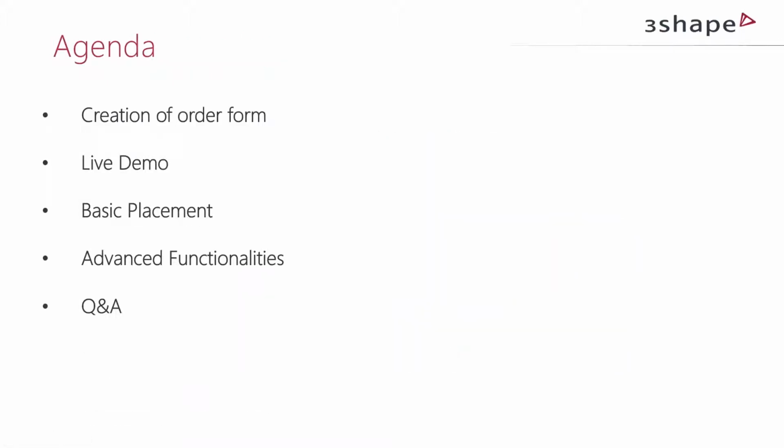That's why the way that I organize today's training is to start from creating an order form. Of course, since we're talking about anatomy design, this is going to be primarily a setup for tooth-supported planning. And then, because I'm not a big fan of PowerPoint presentations, especially in such a good tool as webinars are, I will go directly to the live demo.